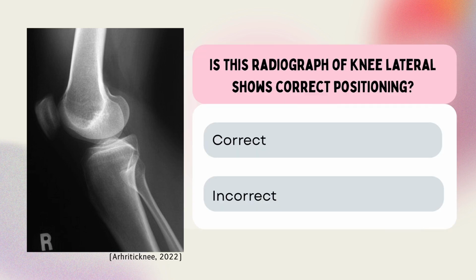So, do you think this radiograph of the lateral knee projection shows correct positioning? Exactly. Let me evaluate this radiograph.